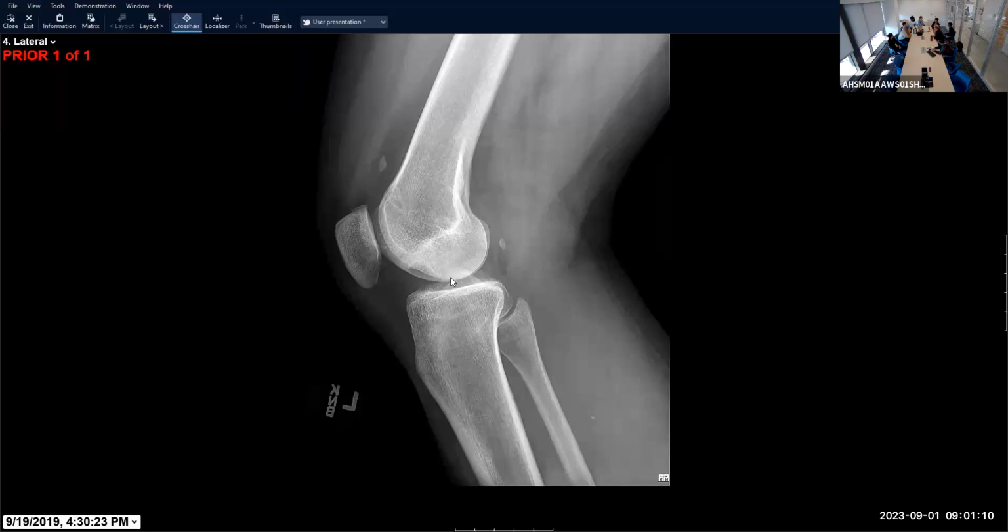No episodes of subluxing or dislocating at all recently. We got an X-ray and he had a big old chunk sitting right there, but hadn't had any recent injuries. So you MRI him and that's pretty much exactly what he had, and you go back and look at the old MRI and it was nowhere, so I don't know. Sometimes they can recruit synovial vasculature and then ossify over time. Yeah, or grow over time, and so sometimes they do change and become more conspicuous.